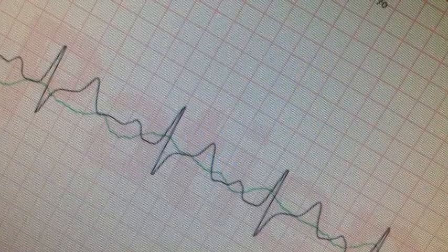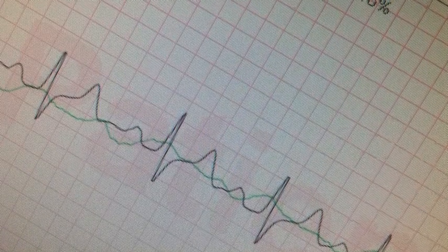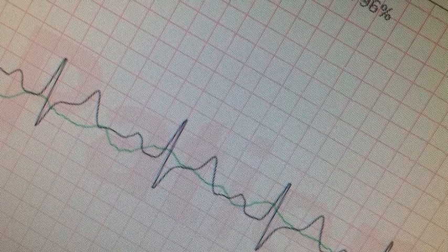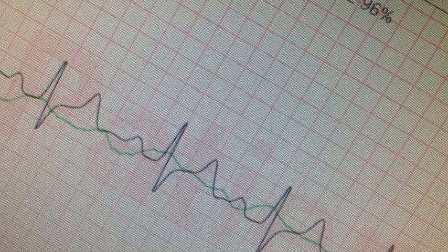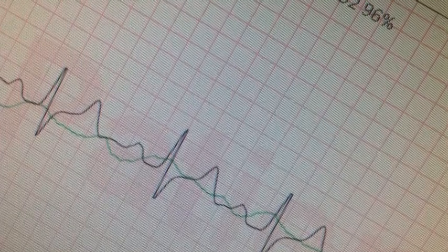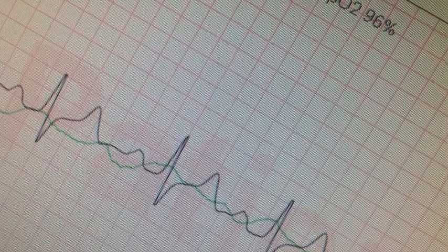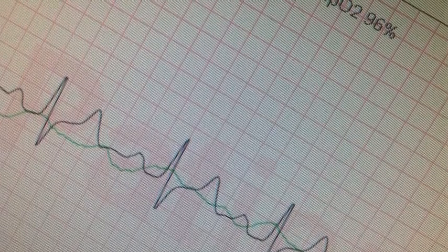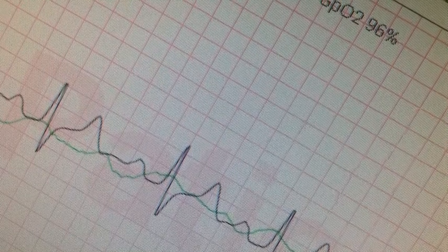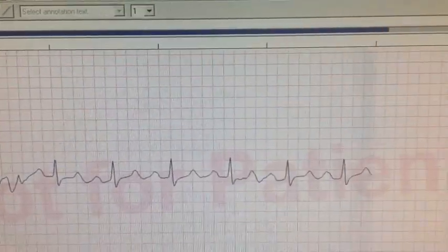Okay, we're back. This time we are looking at the impedance channel and how we can use this tool to take a look at ventilations and periods where there are no ventilations, specifically during rapid sequence induction. Here at HCFR, and as far as I know, I think we were or are the first system in the country to use this technology to look at periods when we're not ventilating our patient. We call that the apneic window.